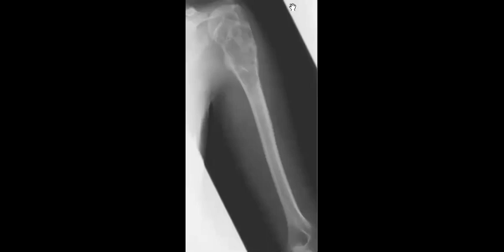So you will mention the lucent lesion in the left humerus, and you mentioned that it is centrally located. It's good to comment on the cortex. You can see the cortex here, and there is thinning of the cortex, right? And there is expansion as well. And maybe it's good also to mention that there is some internal septation. Yeah, Huda, perfect. So it's good to mention that it has a narrow zone of transition.